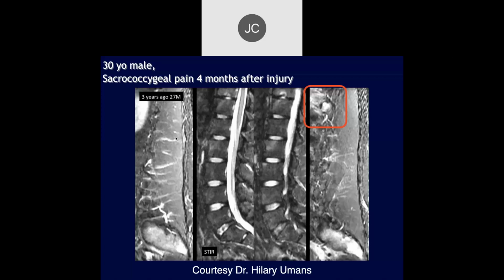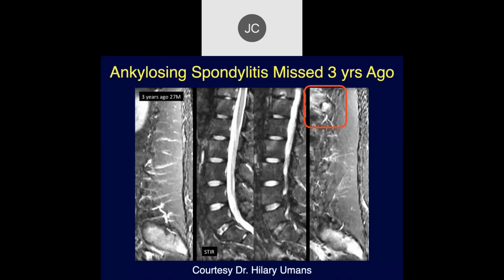And then this was an MR scan 3 years ago of the spine. So we're seeing some edema of the facets, so we're dealing with inflammatory disease. In this patient population, probably ankylosing spondylitis. Yeah, right, ankylosing spondylitis. So this patient's 27, so he probably had ankylosing spondylitis.